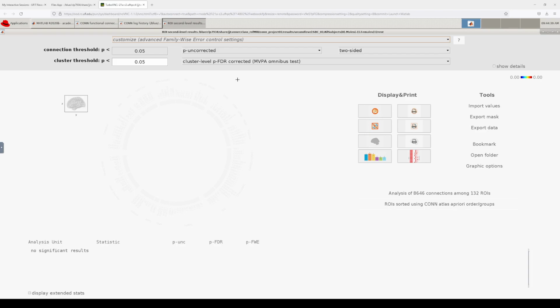So any of this you can run. You can submit screenshots of the connectivity, sort of this circle. You could do the 3D brain, do screenshots. Yeah, I would just recommend doing a screenshot on your computer. You can export and save the images.